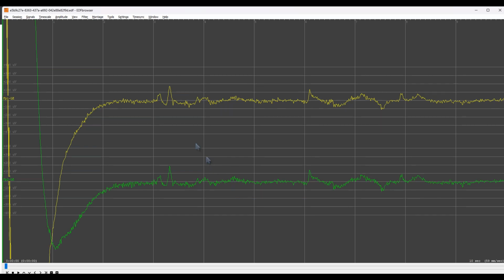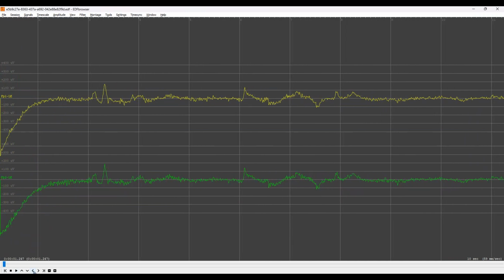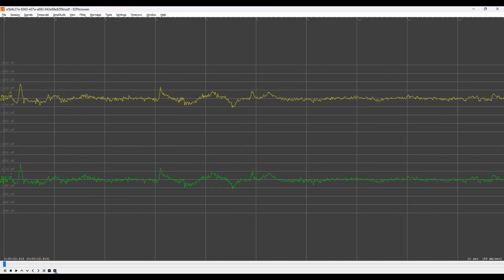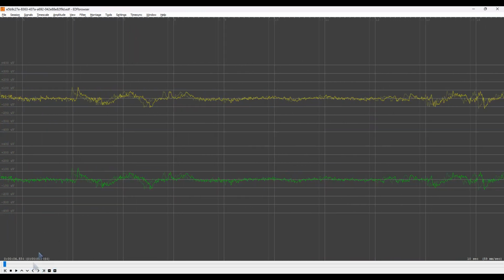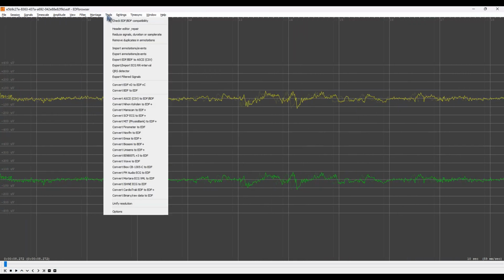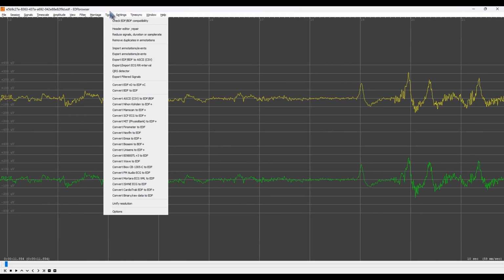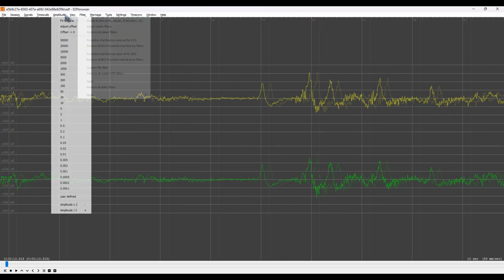Now, currently, this software, because I've been using it and playing around with this, is remembering the folder that I told it to go to last time. But again, you could go to your desktop, find the shortcut for brain maps. When you get there, just come back one, go into training sessions, and then these are all playable files.